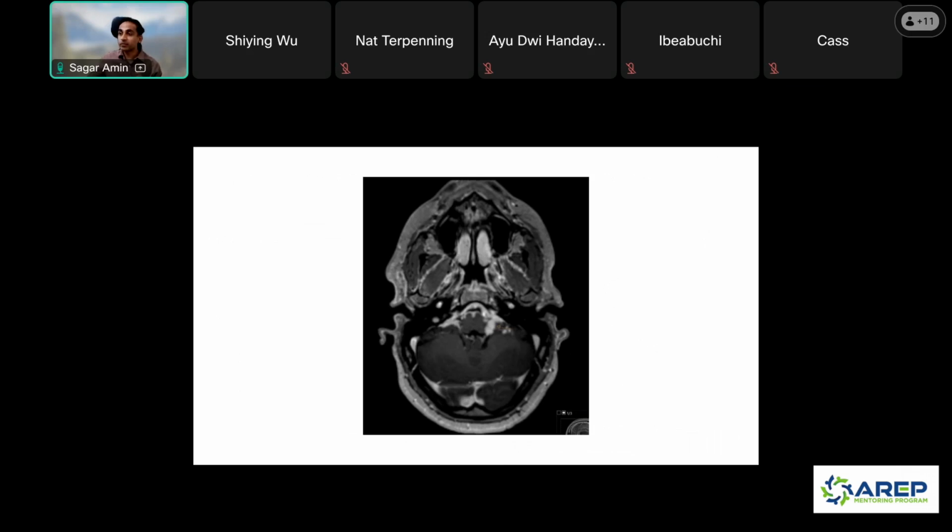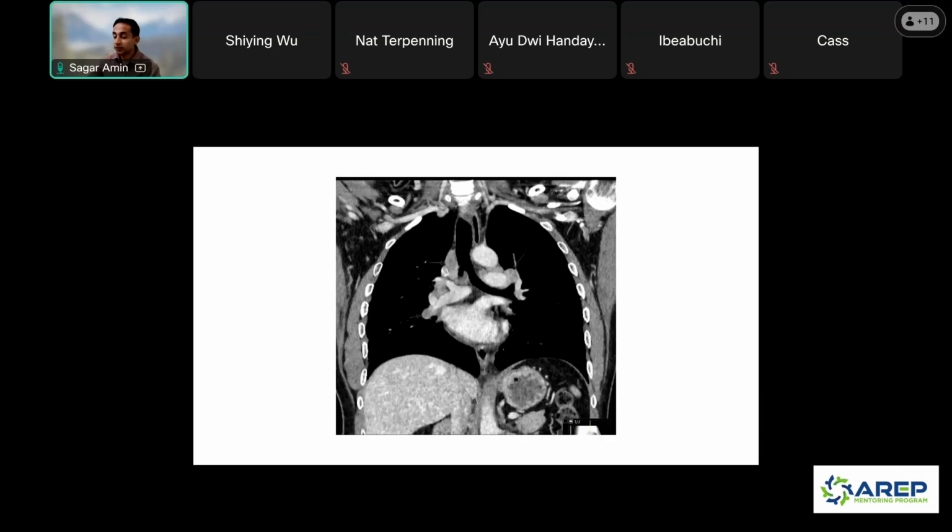So someone said Mets. Sorry, go ahead. Sarcoidosis. Okay. Sarcoidosis, that's good. So IgG4, okay, great. That's a great differential, or some sort of infection. All right, so they got a CT, and you'll notice that they have some lymphadenopathy, right? So it's bilateral, involves the paratracheal area and the hilum.